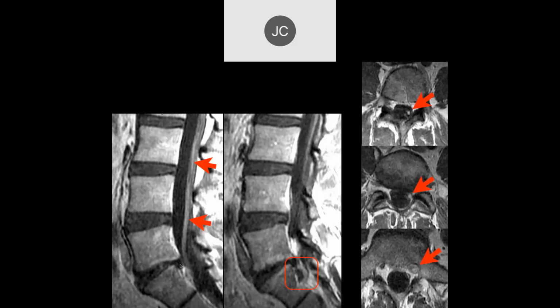What do you think that thing is? Is that just the filum terminale or is that compressed nerve roots? So this is actually an enhancing nerve root coming down through here. And there you see the focal enhancement. It's not on the other side, just this side.